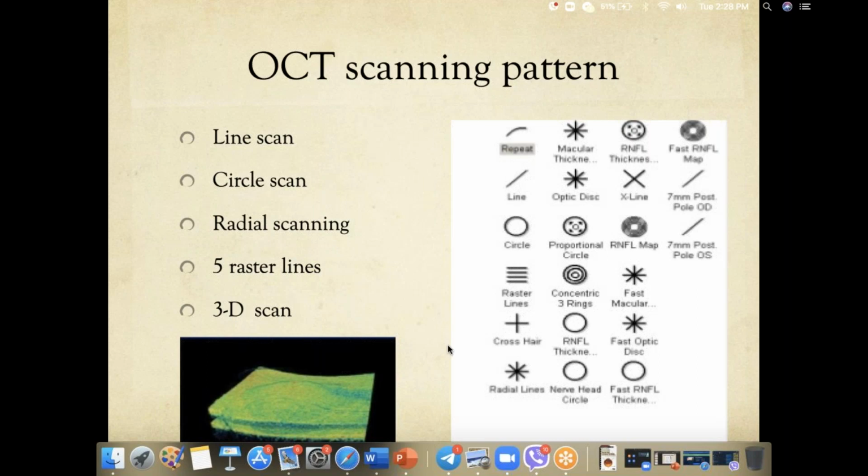But instead, in a retina which has a large pathology, if you just take sections of it, then it will be easier. For example, when you have a retina that has a very small lesion just over here and you want to do a 5 raster, that's not a very good protocol, because a single raster will take it here, then there's a certain around 3 or 5 sections, it depends upon the protocol.